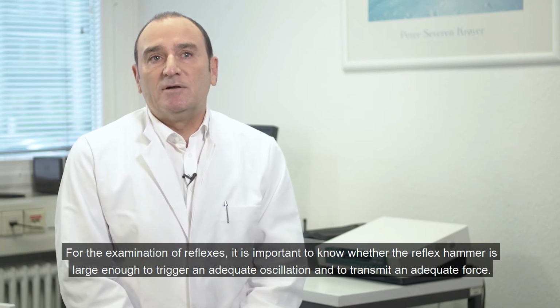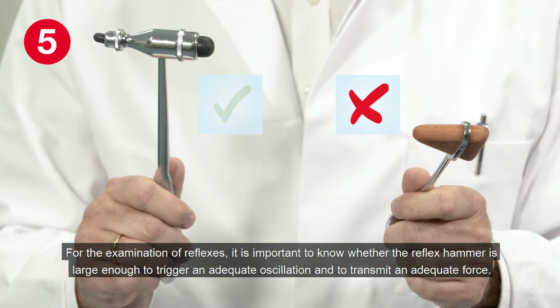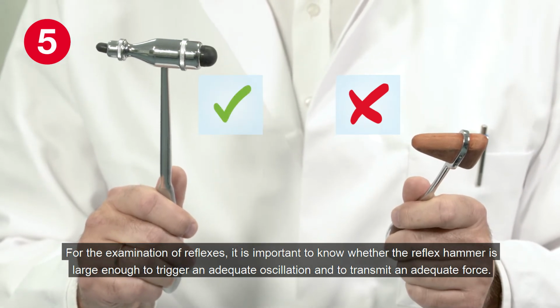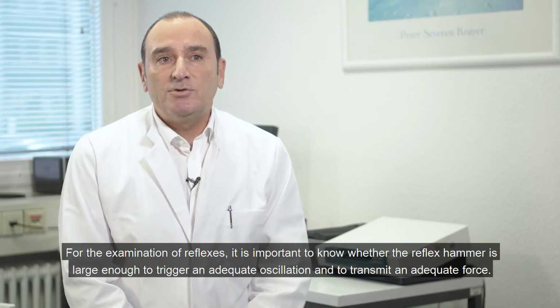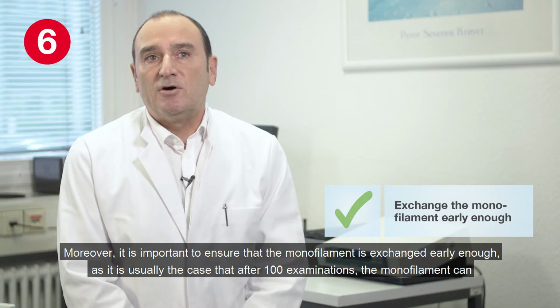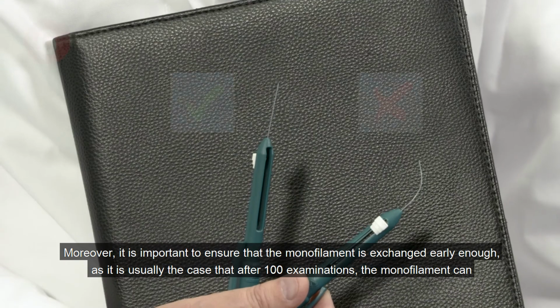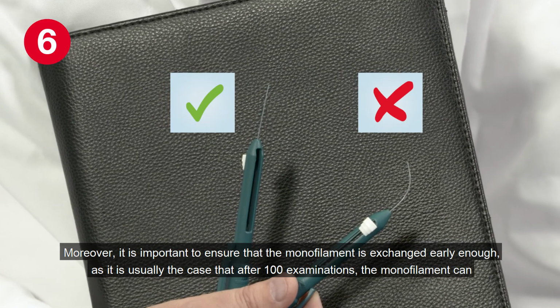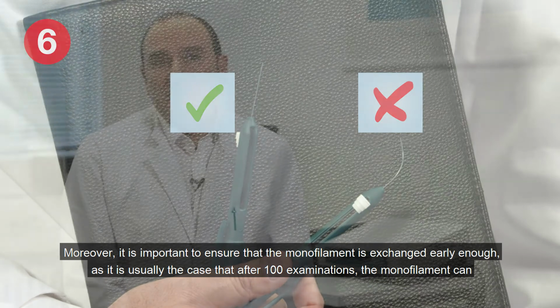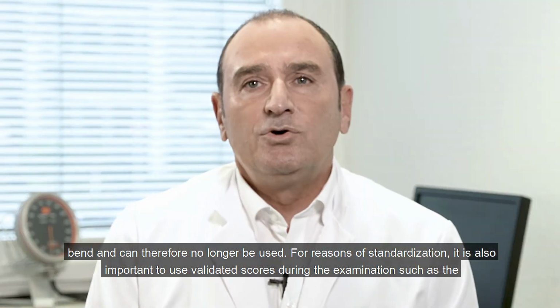For the examination of reflexes, it is important to know whether the reflex hammer is large enough to trigger an adequate oscillation and to transmit an adequate force. Moreover, it is important to ensure that the monofilament is exchanged early enough, as it is usually the case that after 100 examinations, the monofilament can bend and can, therefore, no longer be used.